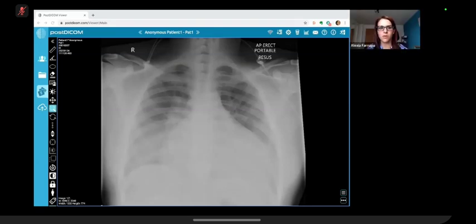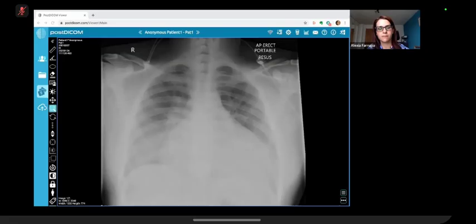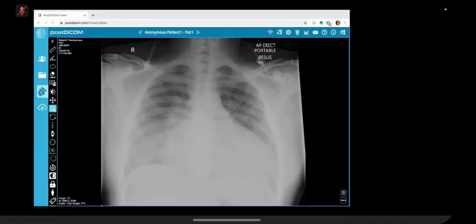So what would you do? In a 19-year-old, having this large heart is quite rare and abnormal. So I'll be thinking if he has any previous congenital condition, like a septal defect or something, which has given that enlarged heart appearance. I would relate with any clinical history in the background, just to check for any septal defects. However, the opacification on the right side is still odd, and this would need evaluation with CT further to suggest what it could be.